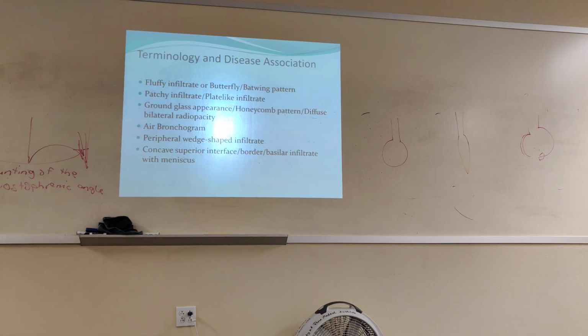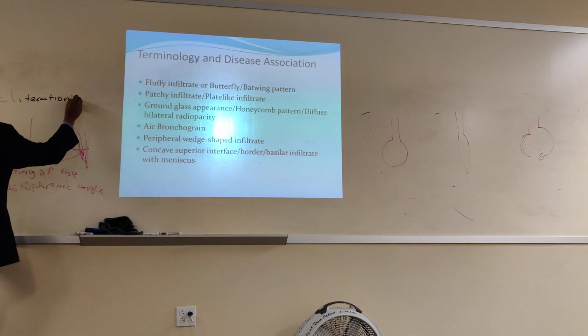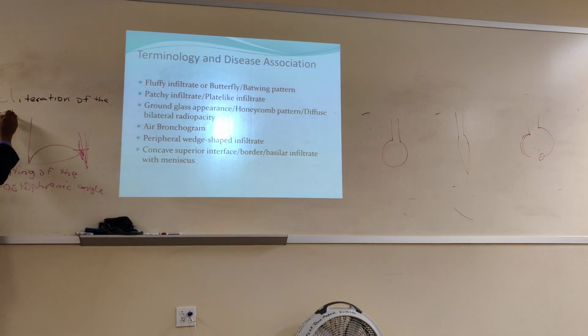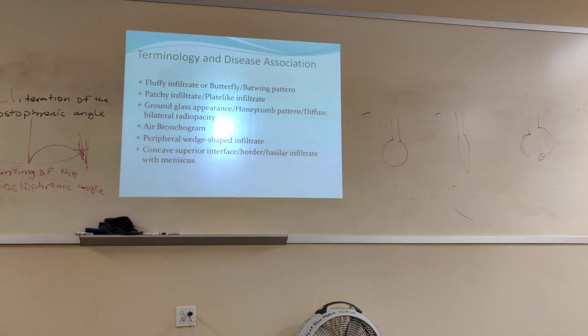That would be pleural effusion. Or maybe they would say obliteration of the costophrenic angle. That would be pleural effusion. Okay? So remember those words.